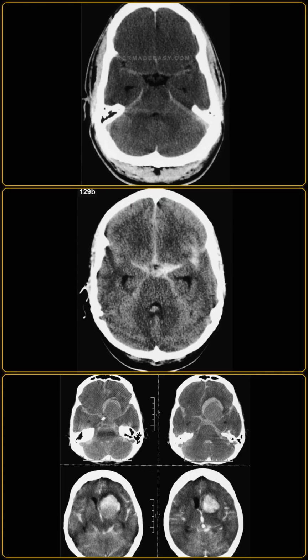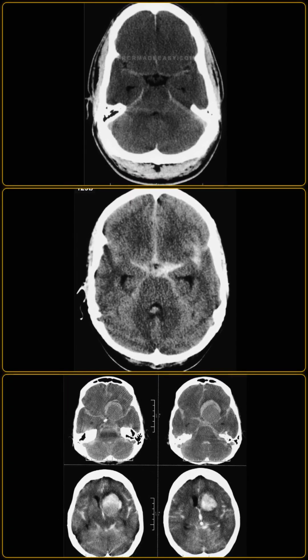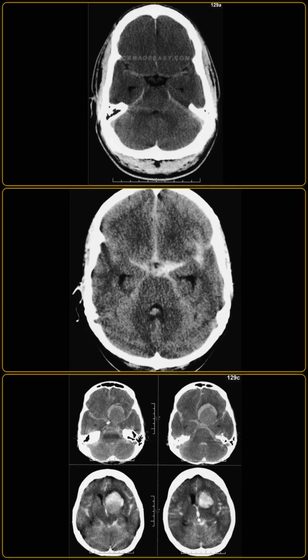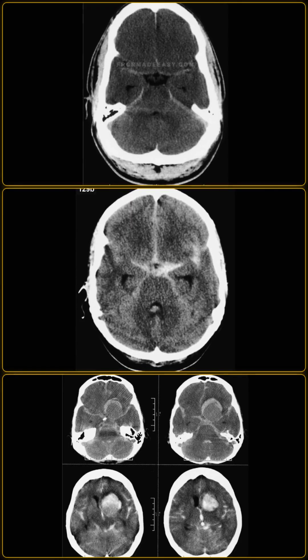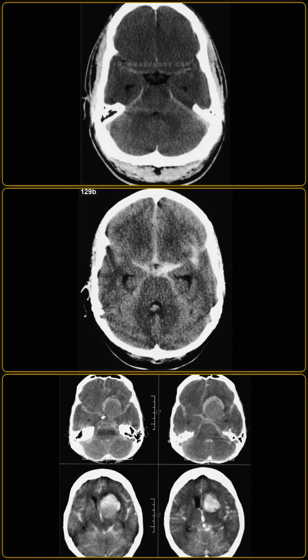What is the diagnosis? And explain the pathophysiology and the classic reversal sign. The diagnosis is global cerebral anoxia, secondary to cardiorespiratory arrest from severe asthma. Global cerebral anoxia, or hypoxic ischemic brain injury, occurs following prolonged severe hypoxia due to arrest, drowning, strangulation, or status epilepticus.